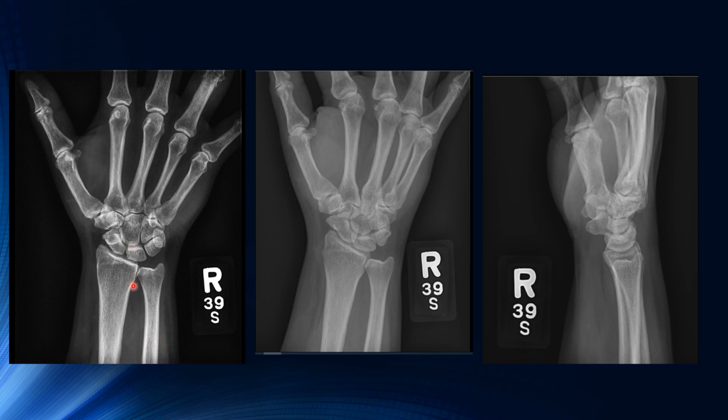We have an open space between the radius and ulna, so we know the PA is good with equal concavity on each side of the metacarpals. All the carpals are here, are oblique. It looks like the hand has been obliqued with 3, 4, and 5 slightly superimposing over each other like it's supposed to. But here, it's almost like the wrist is still PA. It still is partially open here between the radius and ulna. So we need to oblique the wrist forearm portion as well as the hand.